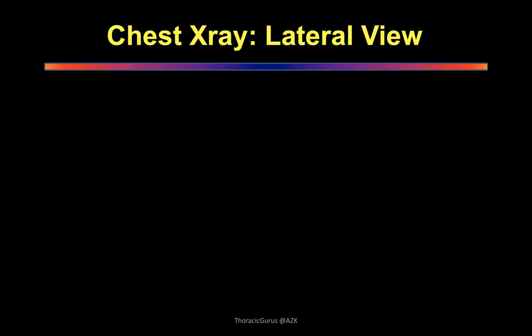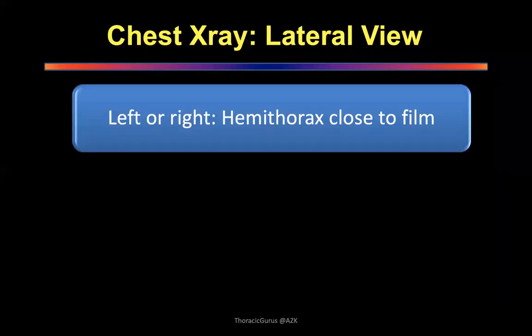So whenever you have a patient who comes in with a pathology and you've got a CT scan showing some changes, you ask for the old radiology. And very often the patient may not have had a CT scan. He would have had only a chest X-ray. If you don't know how to read a chest X-ray, you will miss the fact that this patient had the same size tumor 3 years ago. And on the current CT scan, it is still the same size tumor. You're not so worried. It might be a benign thing. So it is very, very important to understand chest X-rays, okay?